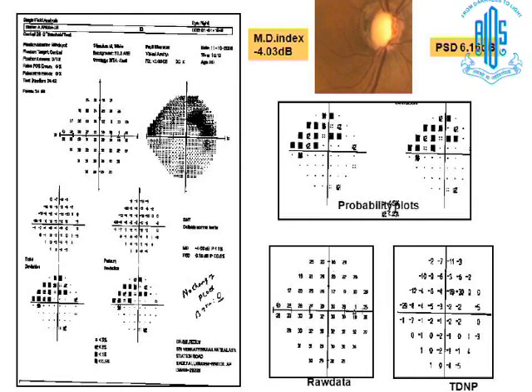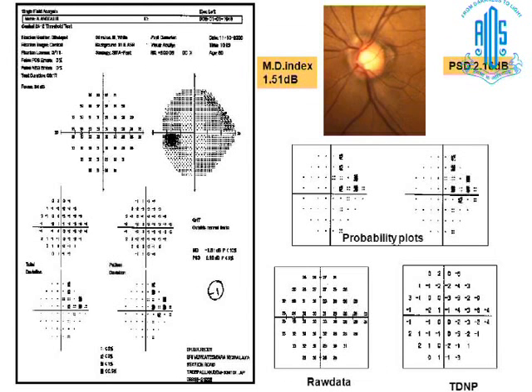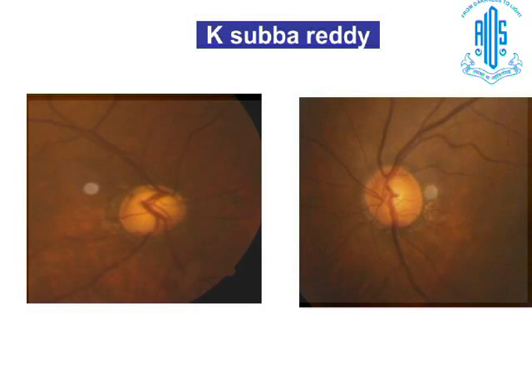And always see the retina, what is the corresponding retinal sensitivity and what is the loss, how it is progressing, and you decide the treatment. Now, we see the cases starting the glaucomatous damage outside 10-2 and progressing towards fixation. Known cases, they're all known cases.